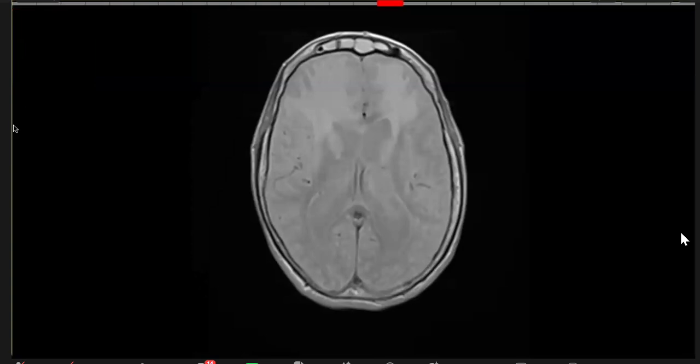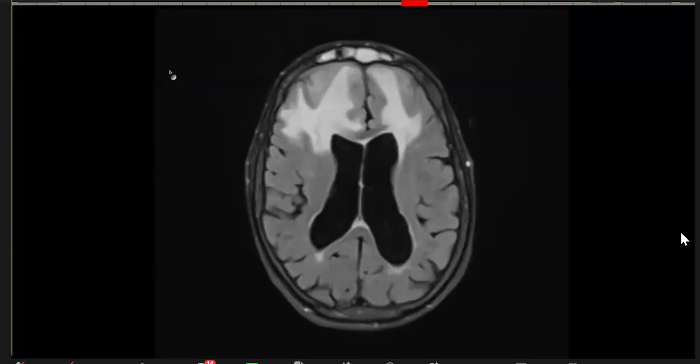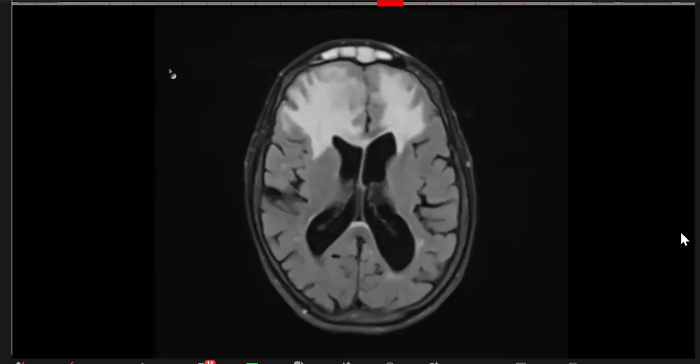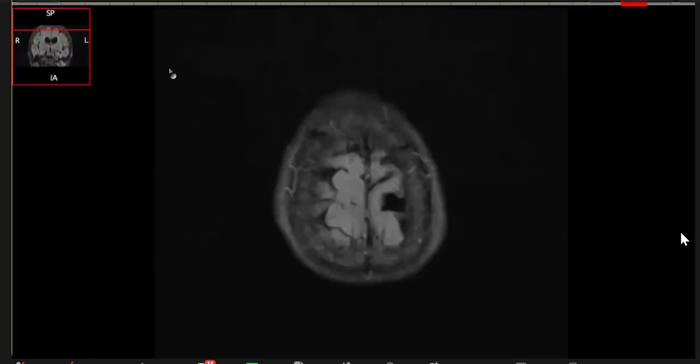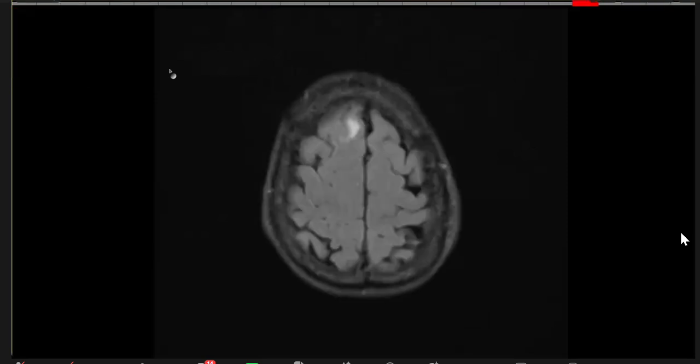So what we did was that we did an MR. So I'm showing you an MR. Okay, sir, these are the FLAIR images. You want me to scroll for you? Yes, sir. So I'm going superiorly, all the way to the top. I'm coming back now.